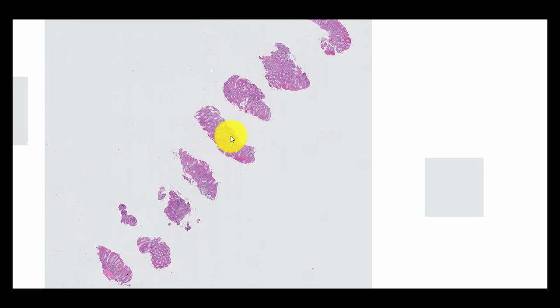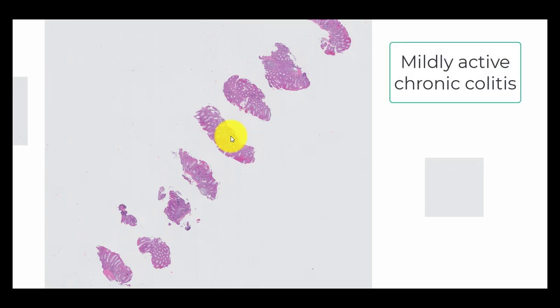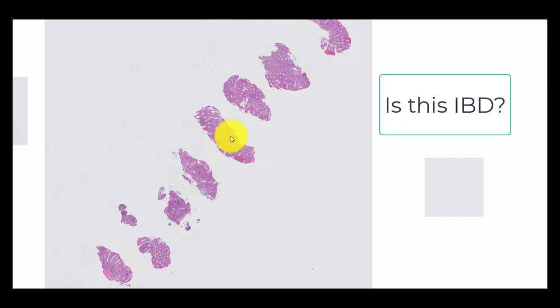So you'll have to agree with me. This really does look like mildly active chronic colitis. The question I have for you guys is: is this inflammatory bowel disease?